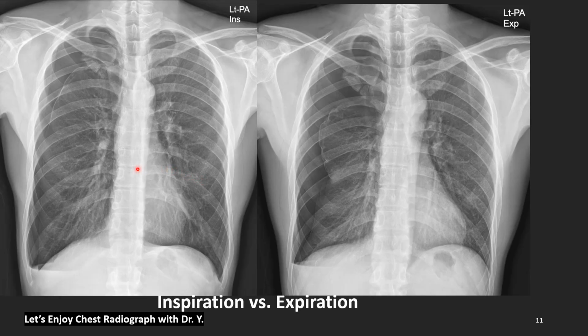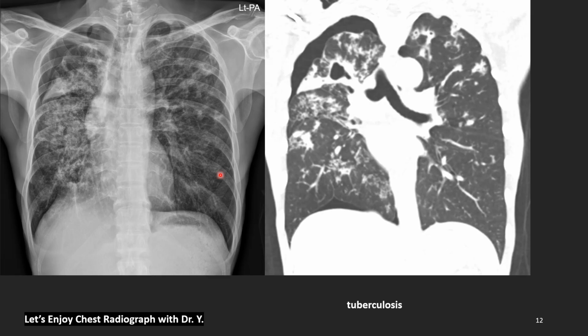Now we are very familiar with pneumothorax on expiration films and inspiration films. Fluid is heavy, air is light, and there are many bullae at the apex. This is the cause of the pneumothorax, and the air leakage started from here. The most common cause of spontaneous pneumothorax among young people is, as we have seen, the bulla at the apex. And many diseases themselves cause pneumothorax.